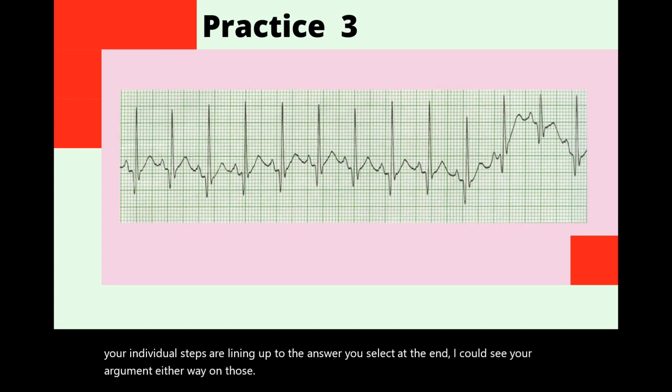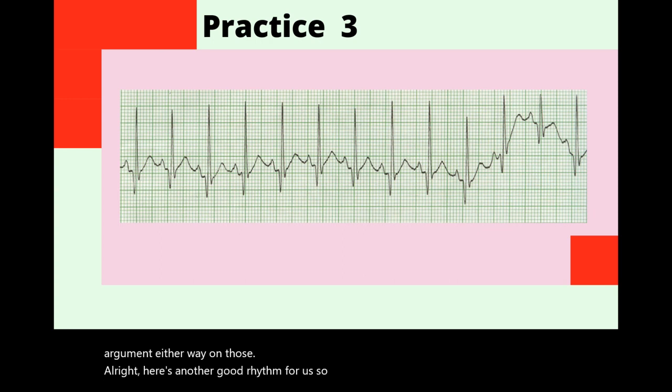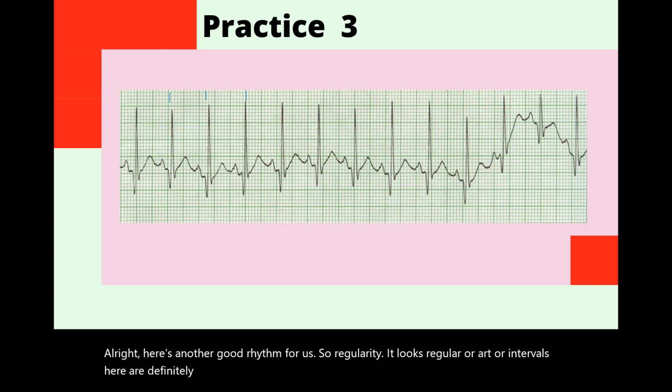All right, here's another good rhythm for us. So regularity, it looks regular. Our R to R intervals here are definitely very similar, all the same, nice equal spacing. So it is a regular rhythm. Our rate is fast though.